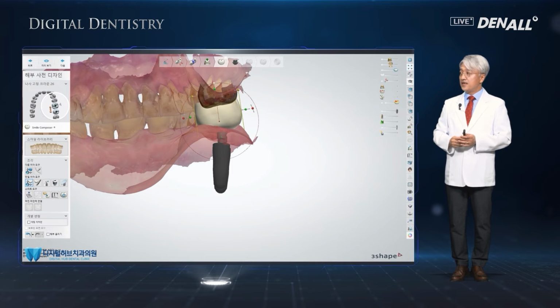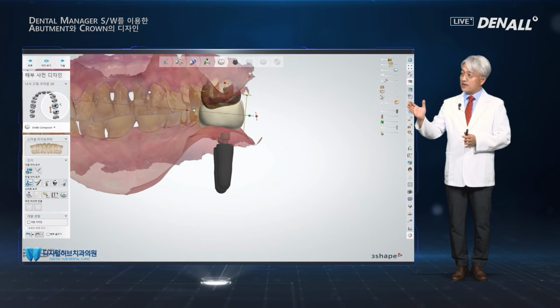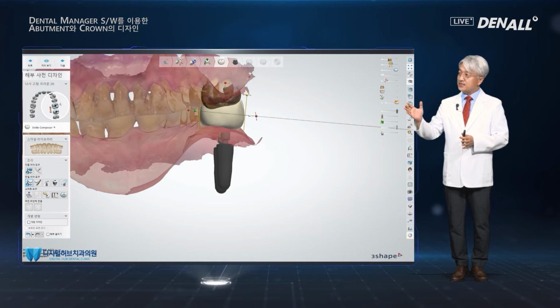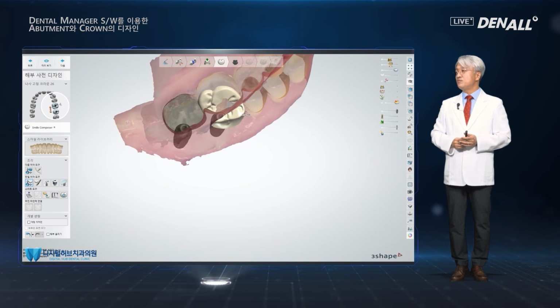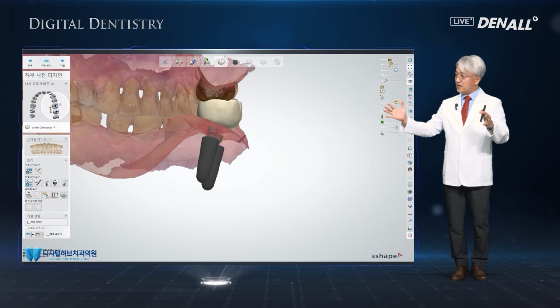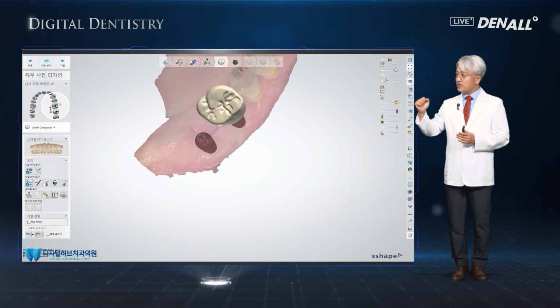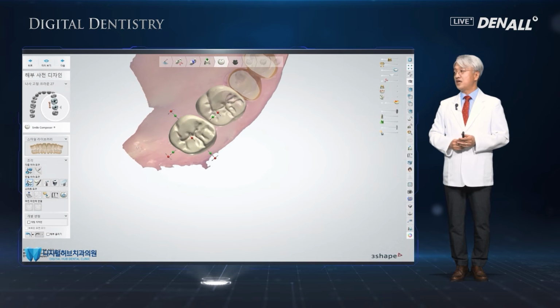This is the upper and lower teeth axis, the relation between functional cusp and central grooves. Overjet relation, teeth axis or width is not good. So this is adjusting the number 26 tooth: occlusal plane, functional cusp, antagonists, central grooves. Tooth width, tip or the tooth tip should be adjusted.